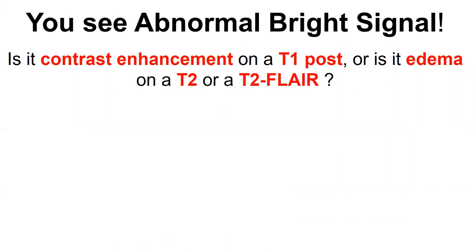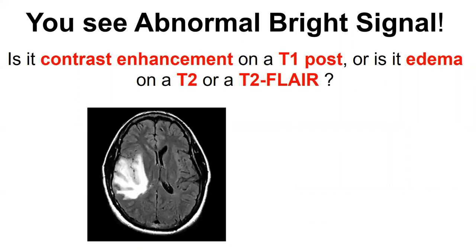All right, you ready for the examination? There you go. The question I would simply ask you, this is the way I usually ask it when I'm doing this in a small group or at a conference: is this a contrast enhancing lesion? Yes or no. Now, I know I'm not showing you a T1 pre, so you could argue maybe it's something intrinsically hyperintense, hemorrhage, etc. But let's just accept that there was no brightness on the T1.